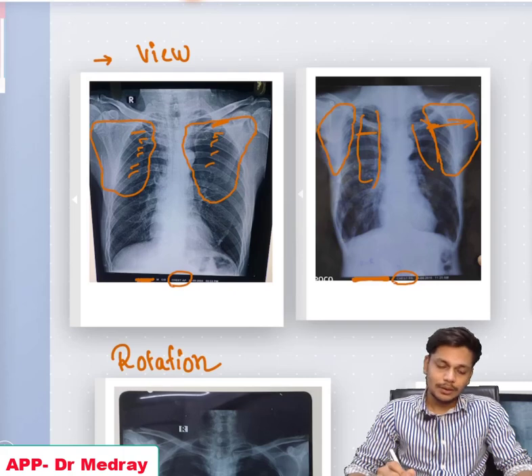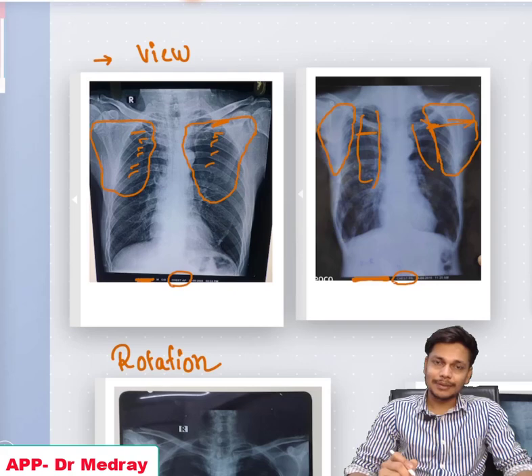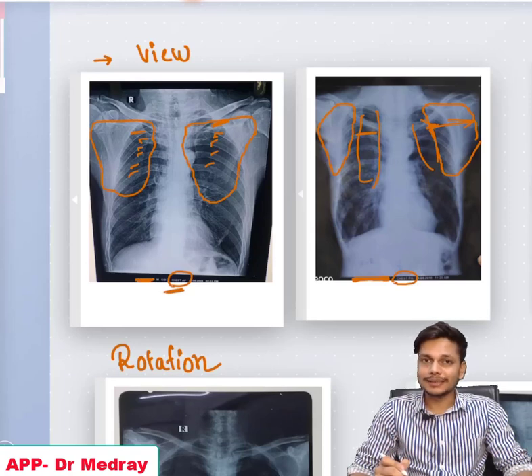in the PA view. So you have to mention whether this X-ray is an AP view or a PA view X-ray. Most of the time in the medicine practical examination you will get a PA view X-ray. Very rarely you will be provided with an AP view X-ray, but you may be asked about the differences between the AP view and PA view.